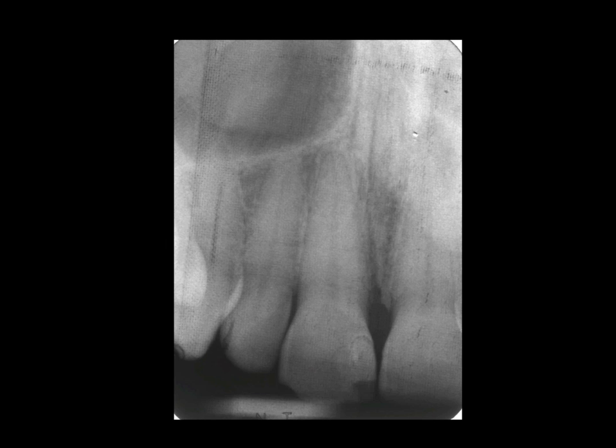Here is an intraoral radiograph of a different patient who also has hyperplastic maxillary sinuses. In this case, we're looking at the central incisor on the right in the middle of the image, but the radiolucency above is the maxillary sinus. Clearly, in these individuals, the normal Y-line of Ennis, which we've shown you before, would not be present. It's very easy to misinterpret normal variations like this as representing pathology, cysts in the jaw.